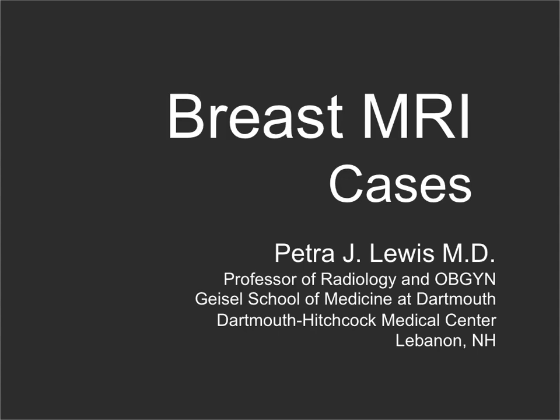So you can stop here if you want. That was just a brief run through of some of the typical findings that we see on breast MRI, but I'm going to continue on and look at some cases, and you're welcome to come through these with me.